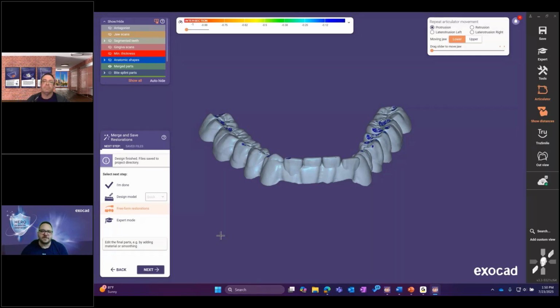And this question just came up about the split denture workflow, to where if you didn't define the bar option in the Dental DB, would it be available via expert mode? And the answer is yes. So when you design your wax up, after that's completed, you'll be able to enter expert mode, utilize the bottom expert mode toolbar or the context menu by right-clicking in the background, and you'll see bar design.